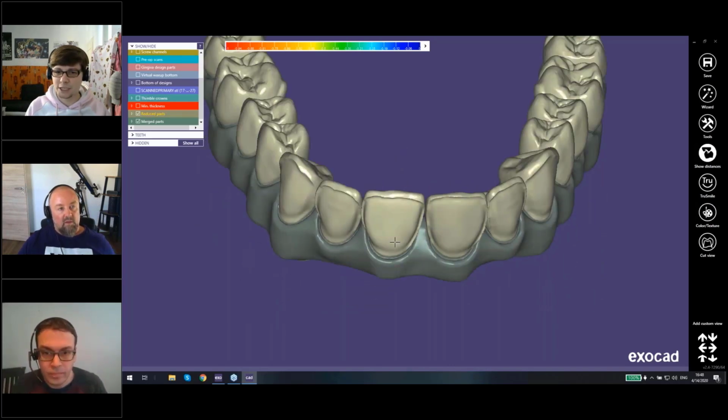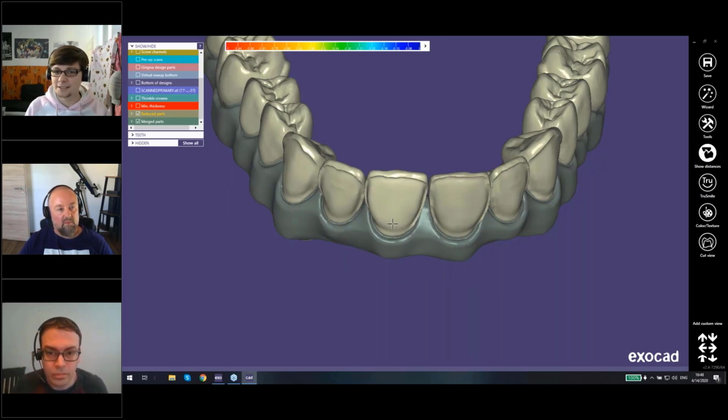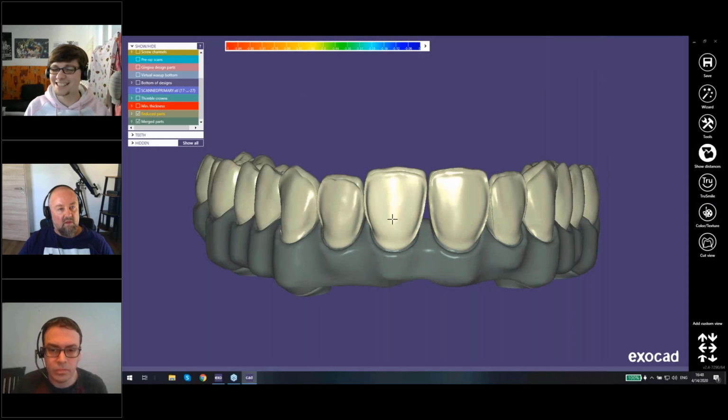But to be honest, to place retentions here on those thimble crowns sounds kind of like you would want to create those out of metal, and I don't think this makes much sense, to be honest.